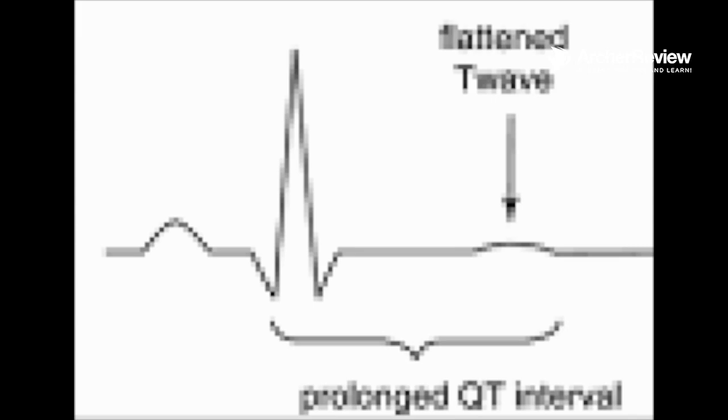Whereas with hypermagnesemia, we had a really nice peaked T wave. It was quite prominent. So, in general, hyper is going to peak up your waves, give you more amplitude, and hypo, they're going to be softened, dampened, flattened. So again, this is hypomagnesemia, not enough magnesium. Those are the two basic EKG changes that you will see.